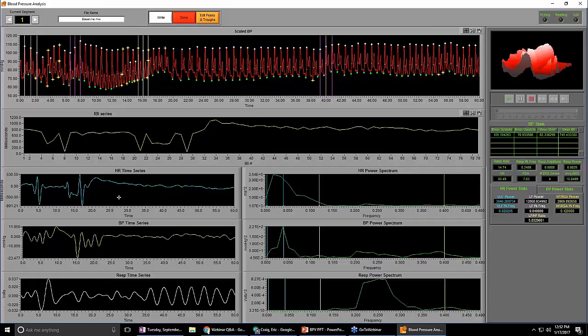A way to interpret this and its use is that if there's some sort of large fluctuation with regards to time between beats, what we'll see here, so for example, we're at beat number 4. So 1, 2, and 4 look like it's slowly declining, but they're about the same time, about 800 milliseconds. And then from 4 to 5, it drops all the way from about 750 milliseconds down to about 350, which is pretty intense. So that's probably not correct.